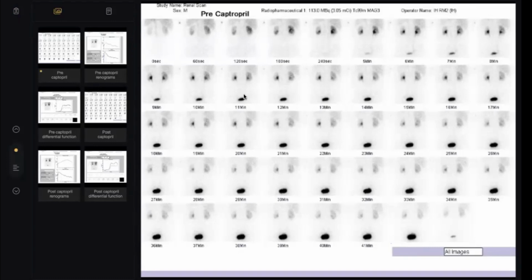Whatever, this is our first nuclear lecture, so don't worry. Whatever mistakes you make, it is acceptable. Again, the name is renal because we see the kidney, and the tracer is MAG3, and finally nuclear study. Renal MAG3 nuclear study.